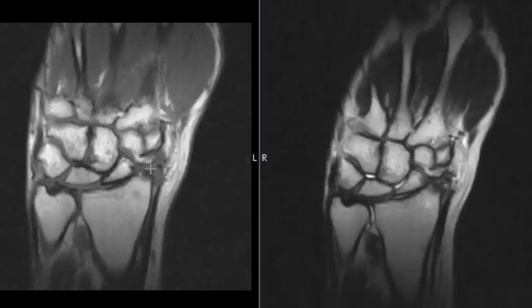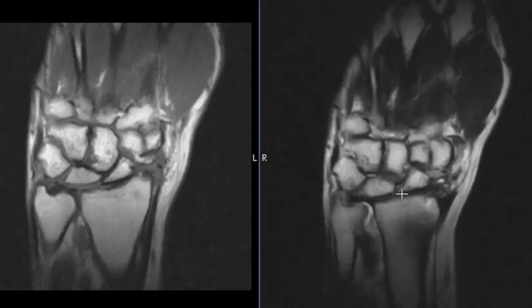There's also something striking here in the carpal bones. These are the carpal bones of the wrist. And this carpal bone in particular, this is the scaphoid bone. It's very small, looks like a little triangle. Normally this is more tubular. This should look more like this bone here, but you can see how it is diminished in volume. And so this goes along with a long-standing arthritic process like rheumatoid arthritis that involves the proximal wrists.